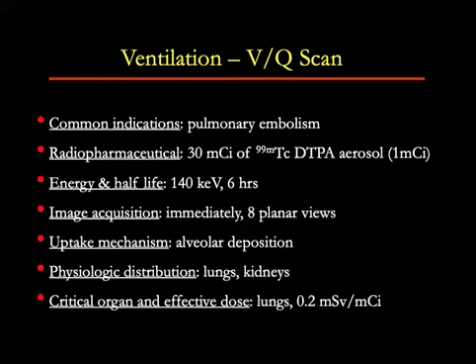After they inhale the aerosol, immediately after that we acquire 8 planar views of the lungs in different projections. These are standard projections: anterior, posterior, right lateral, left lateral, LPO, RPO, RAO, and LAO. The mechanism of uptake is alveolar deposition of technetium-99m DTPA aerosol particles. Physiologic distribution is seen in the lungs. If we wait for some time, we find that the particles are broken down and absorbed by the pulmonary capillaries and excreted from the kidneys into the urinary bladder. The critical organ is the lungs.